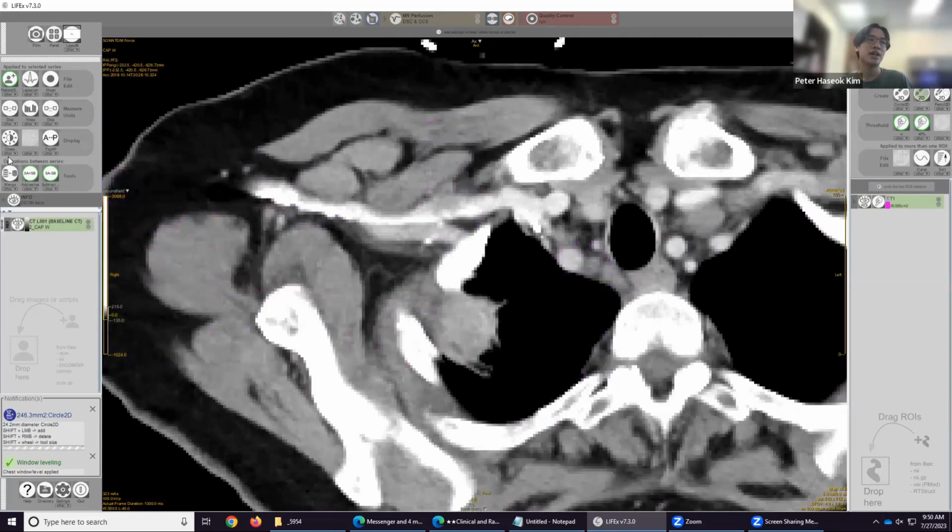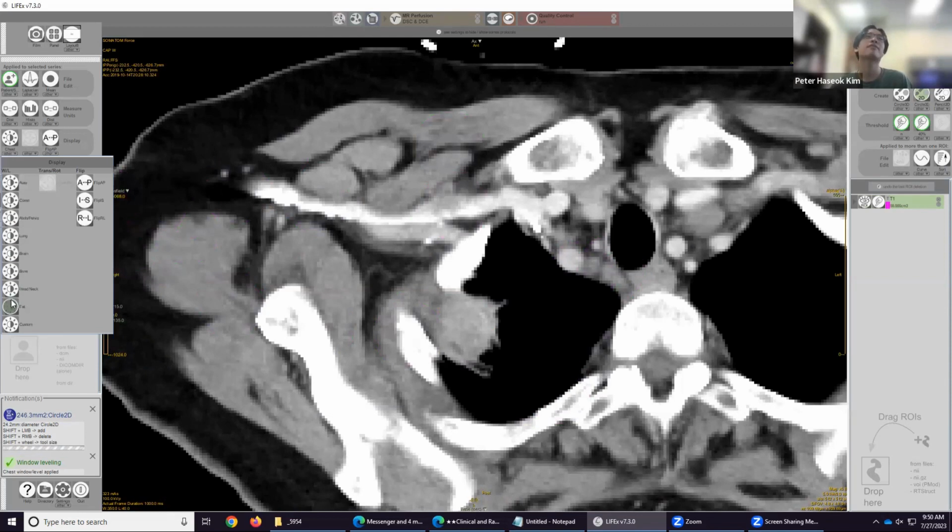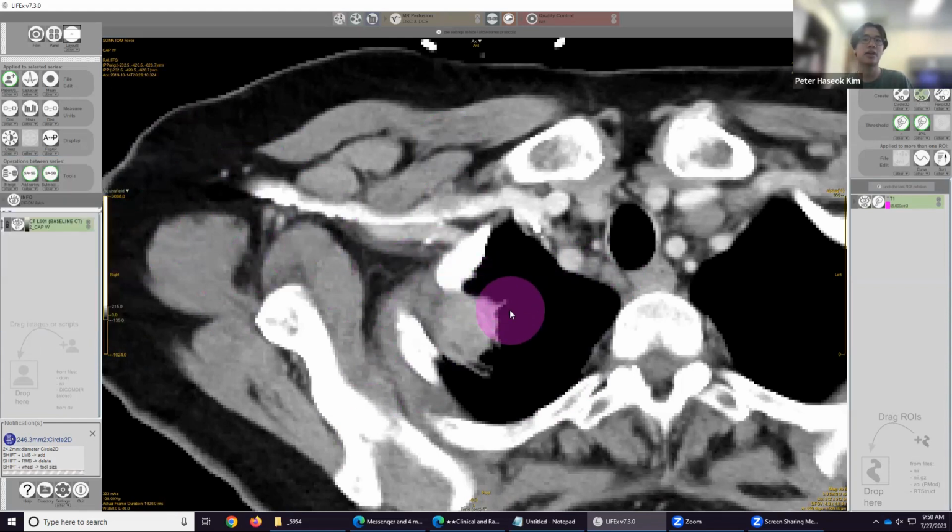So try using chest, use lung to locate. Fat view is also sometimes helpful as well. Whatever view helps you locate and identify tumor and tumor lesion best, use it. But for segmentation, you generally want to stay on chest. And so we are almost done.